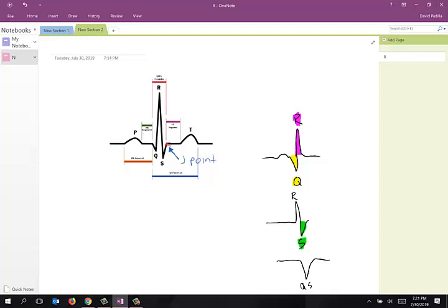So we would look in this section here, if this was on EKG paper, right, if this was a tracing on an EKG paper, we would look for J point and then one small box. So in our first example over here, in this case, J point would be somewhere in this area here, right? So it would be about there. And then same here. And then in the QS wave, it would be about there. So that's J point plus 40 milliseconds.